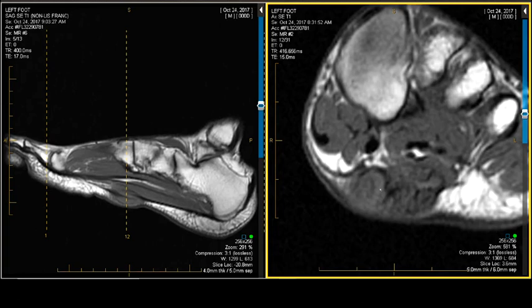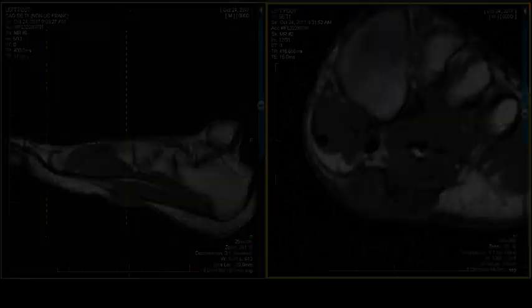Some related diagnoses that don't occur in the foot: elastofibroma dorsi, women, axilla, scapula. But a very similar kind of pattern internally, because they are fibrous lesions. And then the classic aggressive desmoid, they look like this, but they have more linearity inside, and then they have more tentacles spreading into the surrounding soft tissues. Very, very difficult to cure.